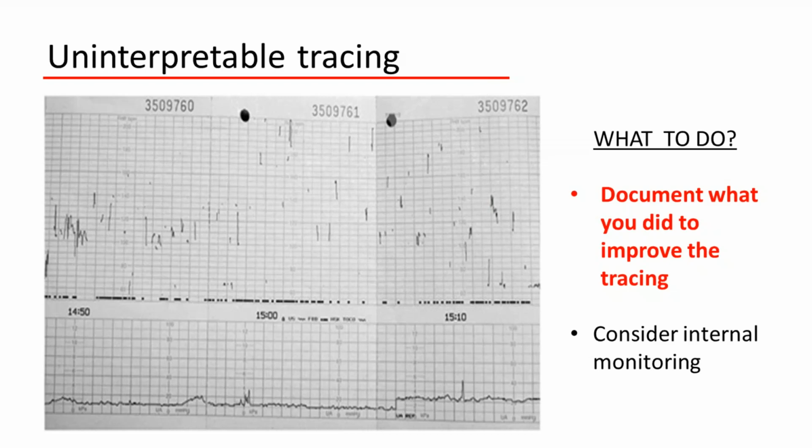So if you're really struggling with getting a good tracing that you can interpret, then maybe you need to suggest that an internal fetal electrode be used or intrauterine pressure catheter. You don't want to just let it go on and not respond to it.